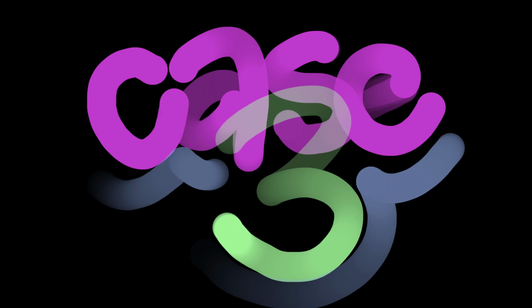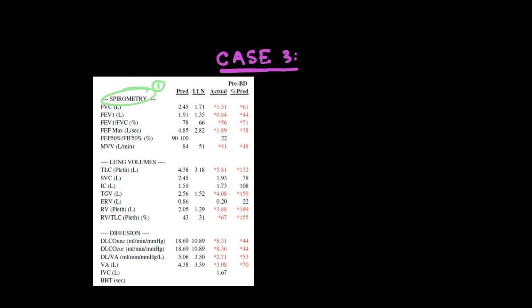Hello guys, it's Meredith here again, and we're going to do a third case. This one's a little bit long, but it covers multiple topics, and so I'm hoping at the end of this you'll have a better understanding of the basic interpretations of PFTs. So here goes. Spirometry number 1.